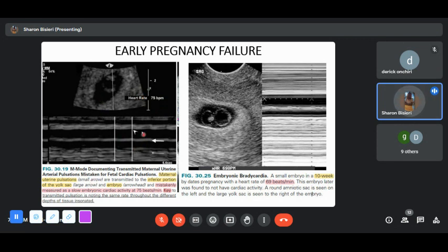How we can tell apart the actual embryonic heartbeat from maternal transmitted pulsation is that if you look at these other structures that are cut by our line here, you can see the same pattern of disturbance cutting across all these different layers. So if you calculate using our embryo, it will give you the heartbeat, but because you're also seeing the same pattern of disturbance, you can confidently say that it's of maternal origin and not of embryonic origin.